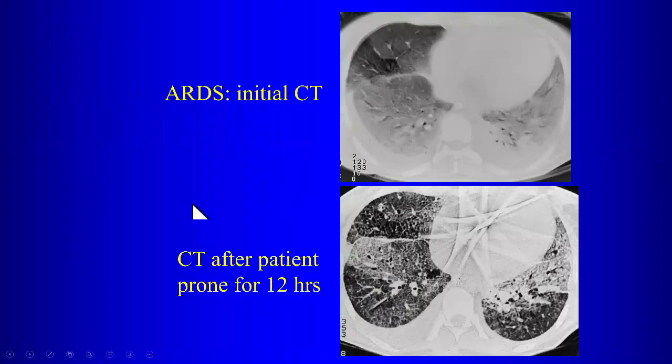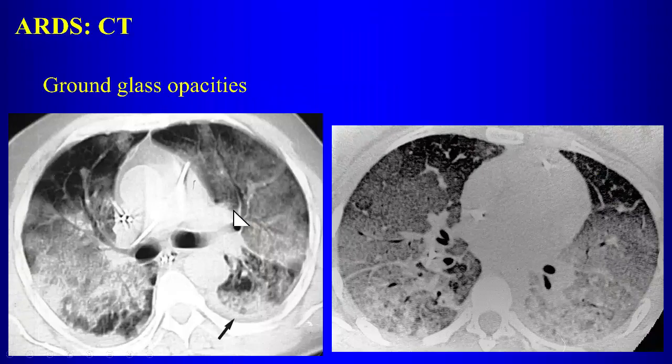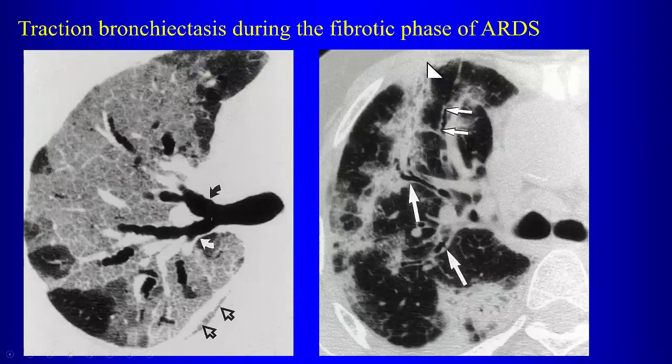And then these patients, they also treat them by rotating and turning them to even out the oxygen exchange throughout the lungs and to minimize lung injury. And so here, this patient was prone after 12 hours, and you can see that from being prone, there's still that gravitational gradient, only now it's more anterior because of the patient's position. Whereas here, it was mostly posterior because of the patient's position. So we can have ground glass opacities, diffuse ground glass opacities. We can see that with ARDS.